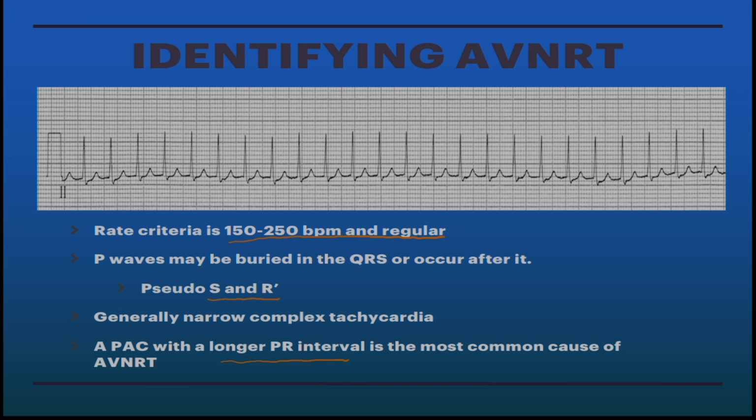So let's look at our rhythm up here at top and do some interpretation. I can see that it's very fast. It's 150 beats per minute.